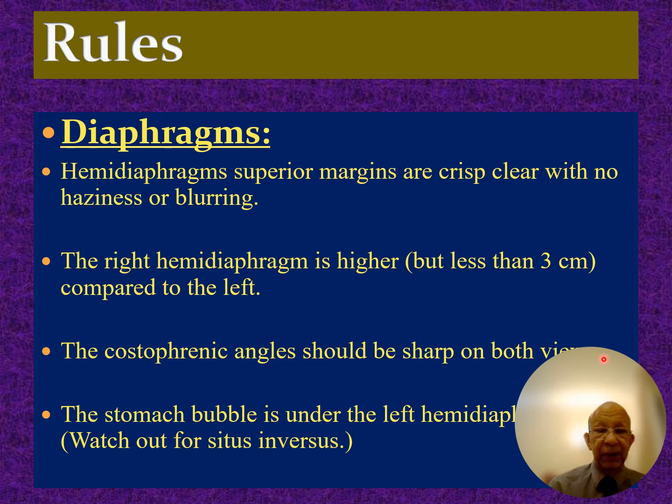They should be sharp and deep, and the stomach bubble is under the left hemidiaphragm. So beware of situs inversus. Okay, now these are important rules that you should actually be aware of.